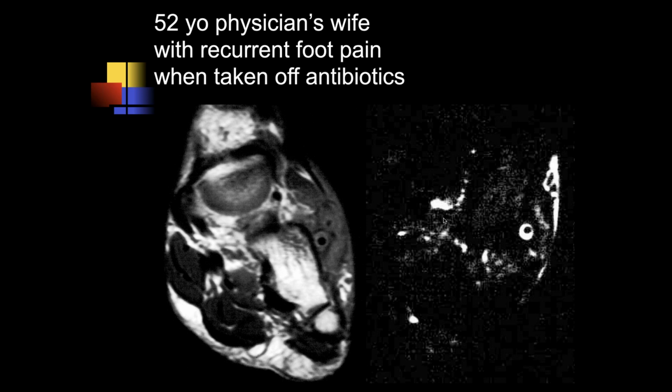We have a 52-year-old physician's wife with recurrent foot pain when taken off antibiotics. And this patient basically had the same history as the prior patient. They lived about a mile away from each other. Okay, so again, there is some edema, and it looks like a foci of low signal there. I think this is the dorsolateral aspect of the foot, and that's concerning for a foreign body. It could be another thorn. Here we can see a linear foreign body. Yeah, another palm thorn in the foot.